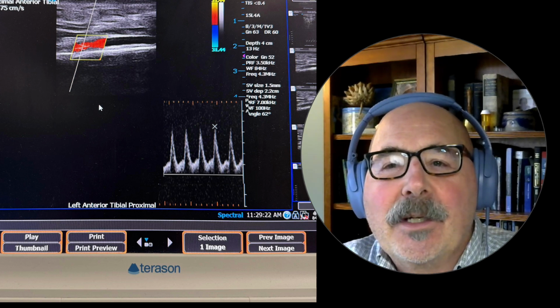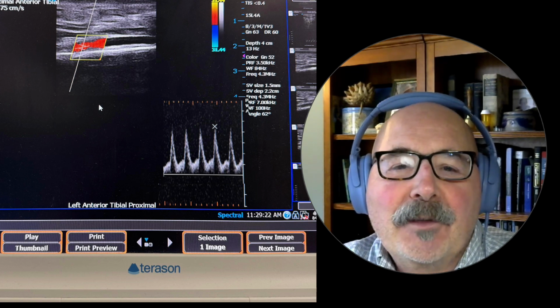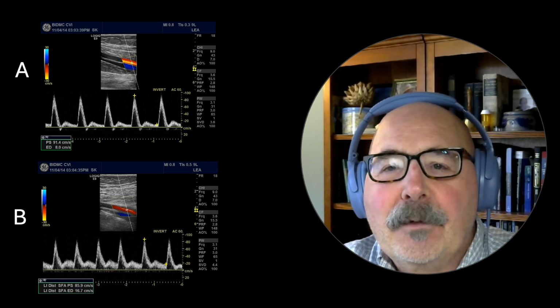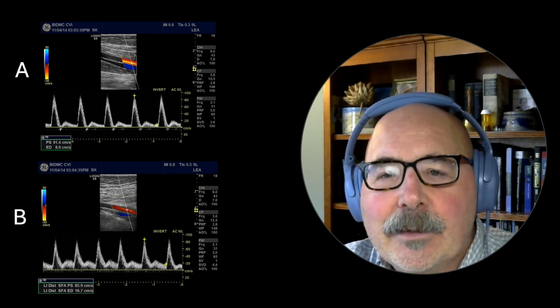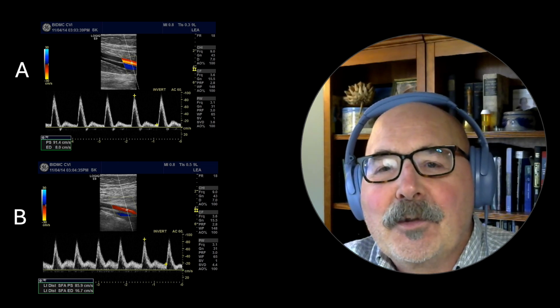In my last video, I shared this waveform and I promised that I would spend more time on the topic of monophasic waveforms. Today, I'm only discussing peripheral artery waveforms. Sometimes when we hear the waveform's monophasic, we start to assume a worst-case scenario. Well, take a deep breath, study the waveform, and let's see what it tells you.